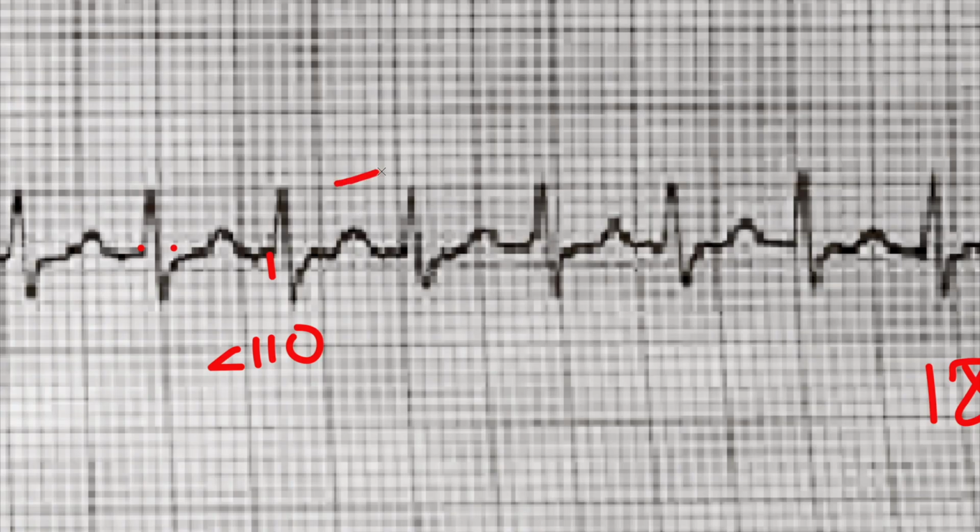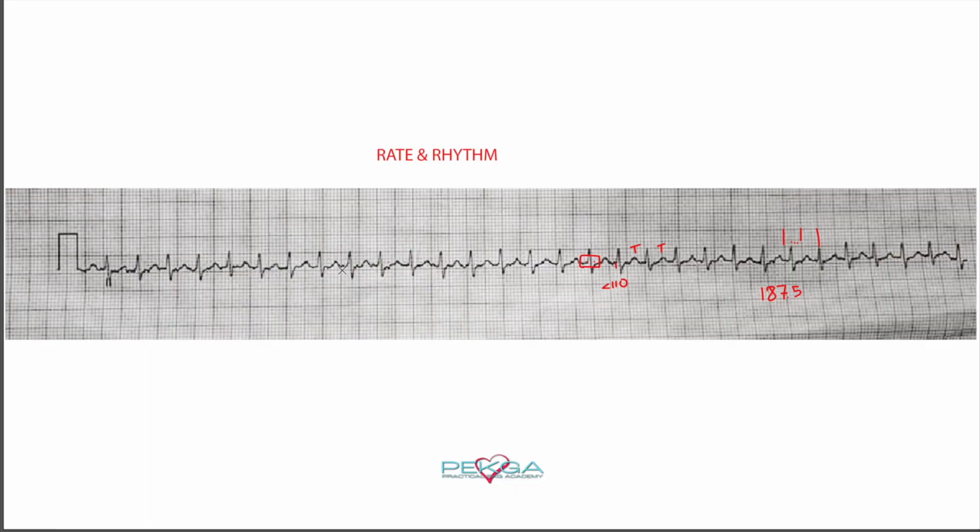The T waves are present. The QRS is narrow. The P waves, we can't make out the P waves. The P waves are somewhere in here, you would think, right? When we take a look at the 12 lead, we'll try to look for that. So the only thing you can reliably say here is you have a narrow complex tachycardia, right? Tachy meaning fast, and that implies that the rate is over 100. Here the rate is closer to 200.